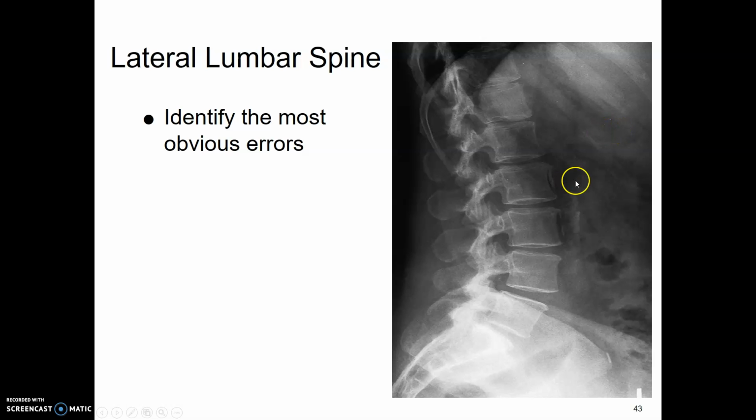So some identifiers here for me, similar to that of lateral chest, which you guys know by now, to determine if the chest is rotated, we're going to look for these posterior ribs. And I'm seeing some big posterior ribs here. So what does that mean to me? It means the patient's not lateral. I also can see double borders. As you can see, there's two lines here on the vertebrae, on almost all of them coming all the way down. It gets lower down at the hips, which means the hips are probably more lateral than up here by the chest because they're bigger. So you shouldn't see two borders of the vertebrae in the back. So this patient's rotated.